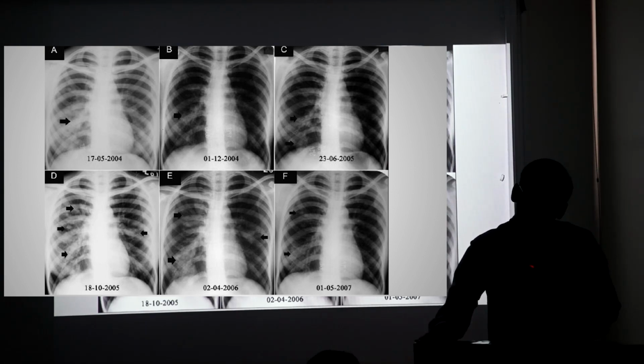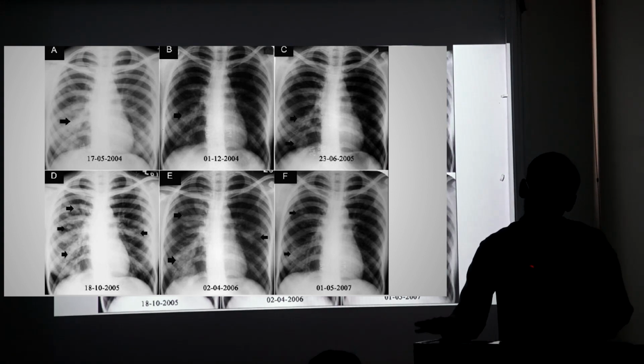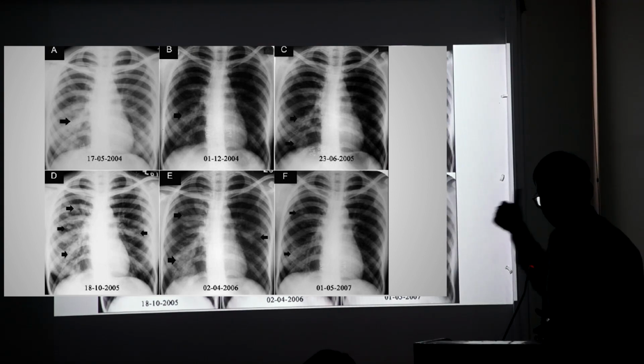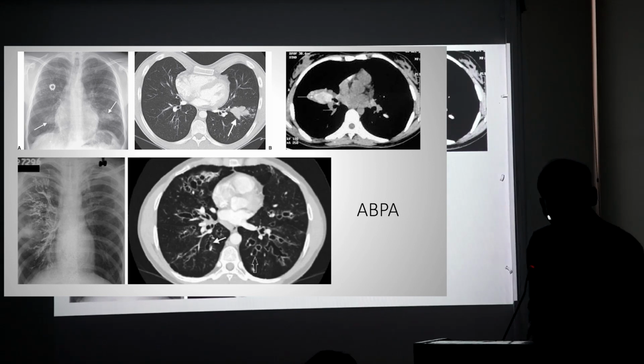The patient is a 25-year-old gentleman having asthma who does not believe that he has asthma. He does take inhalers irregularly, whenever he ends up with an exacerbation. So the X-rays were taken whenever he had an exacerbation. So, what can we see over here?